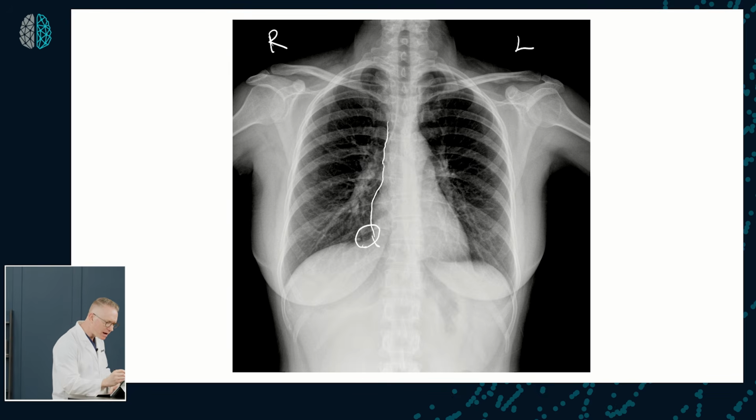On the left side, you can see the aortic knob up here. And then there's the pulmonary artery coming out, likely right there. And remember, the left atrium is typically tucked in and around in a more posterior area. But it would typically start to fall in this area, and that's sometimes where you see the left atrial appendage on some patients.